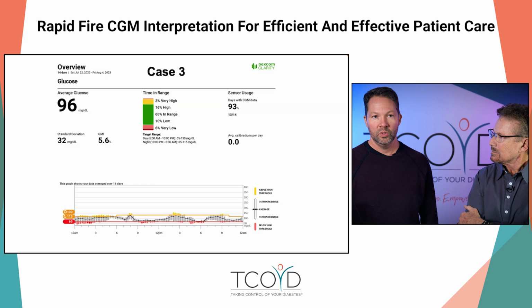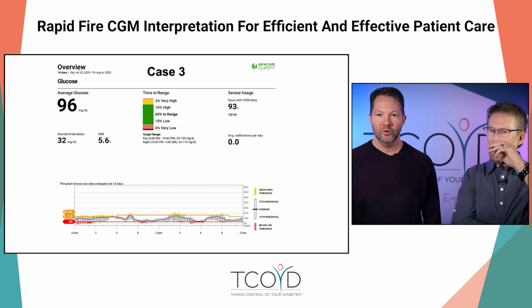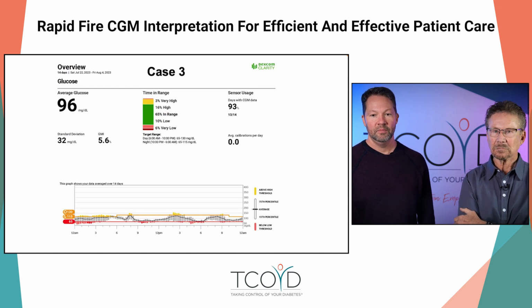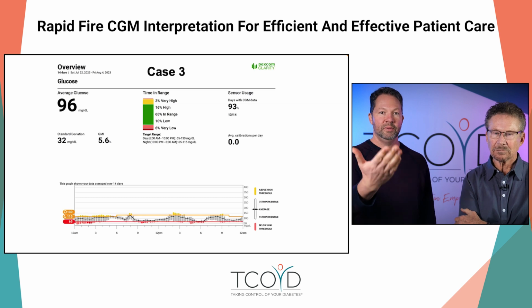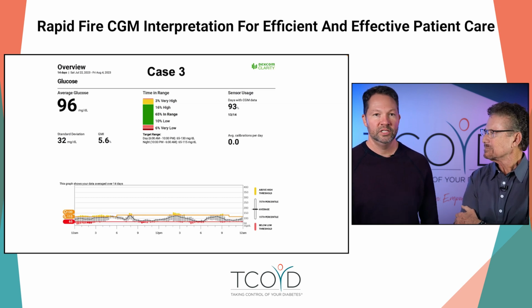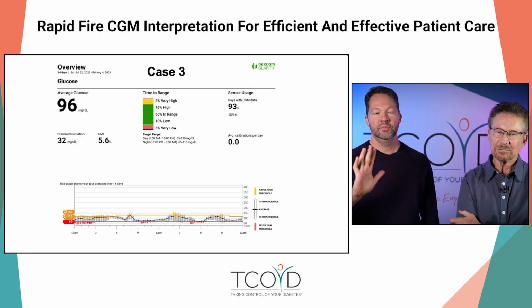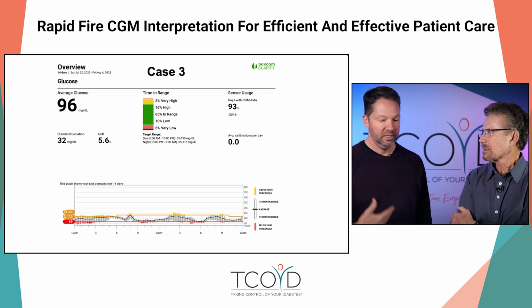Yeah. So this is like one of the most... And she lives like this. Yeah. This is one of the most difficult types of patients to treat, that they get it in their head that they have to have perfect blood sugar control. I bet this patient has been praised over previous years and even brags about having an A1C of 5.6. But these are the patients I'm worried the most about because any one of these lows can be catastrophic.